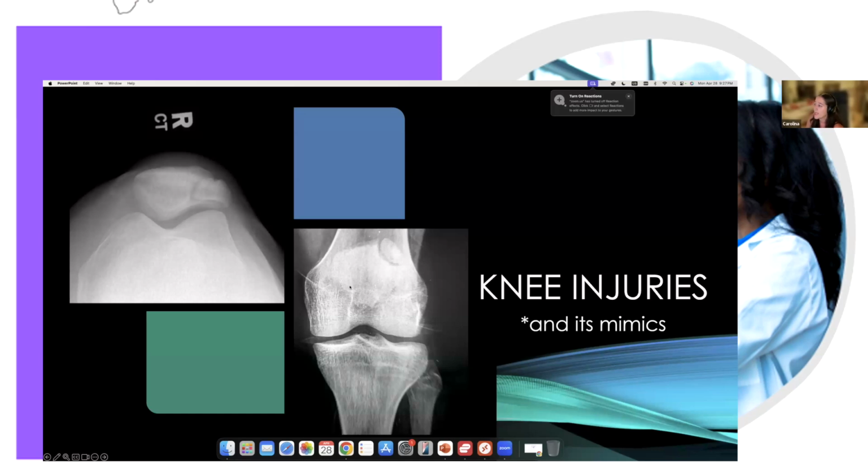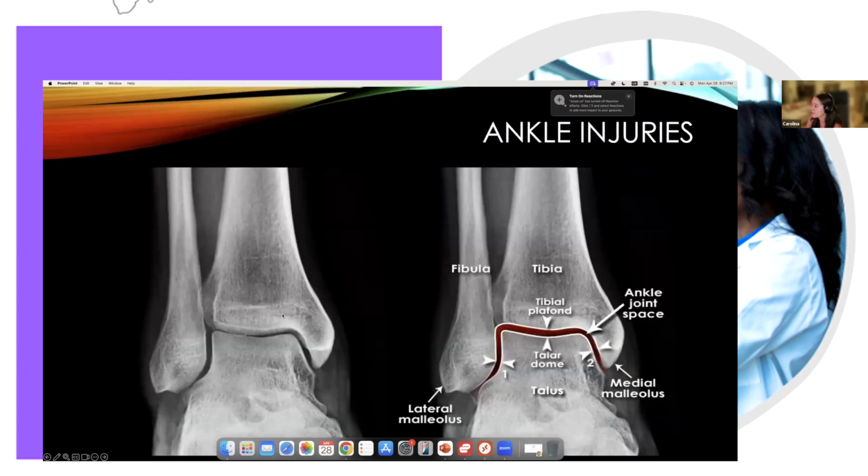And in the majority of cases, you're going to see that in the superior lateral aspect. We don't say always, we don't have an always in radiology, but this would be the majority of cases. So kind of keep this into account. Now let's go further down.